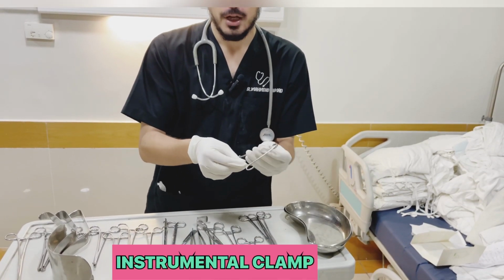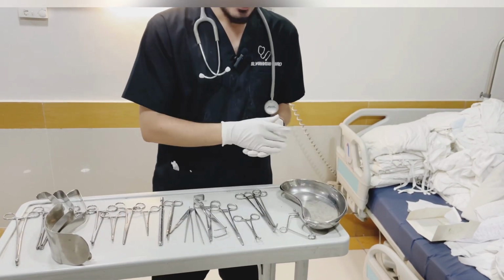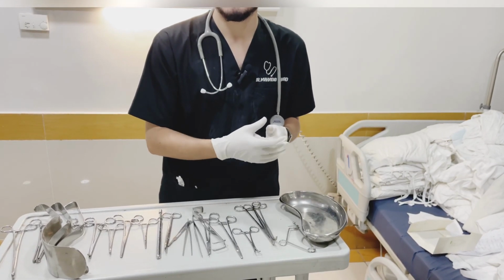And this is known as the instrument clamp, usually used to clamp different instruments. The kidney tray we usually use to hold the different bandages and small instruments.